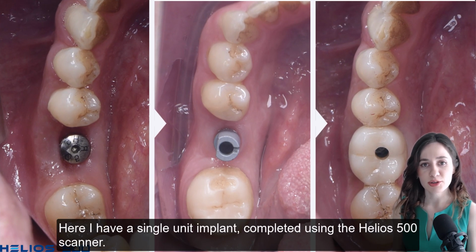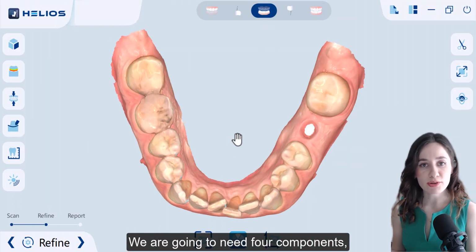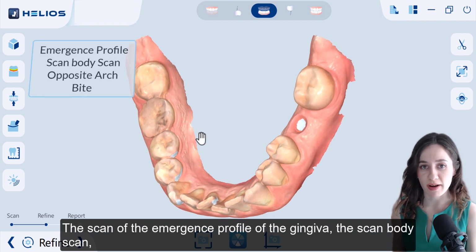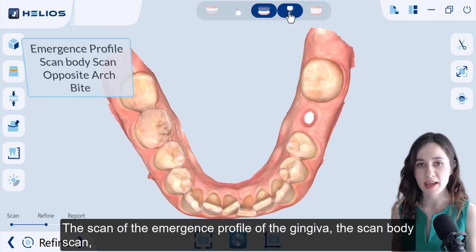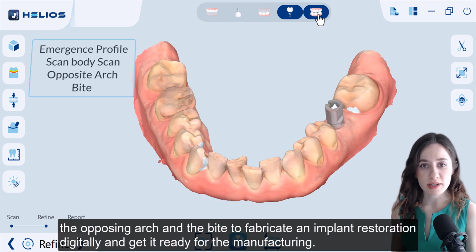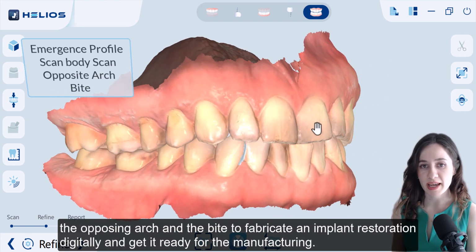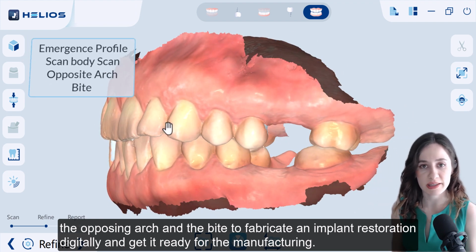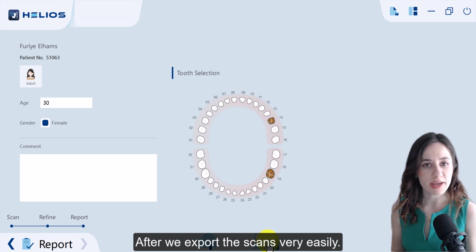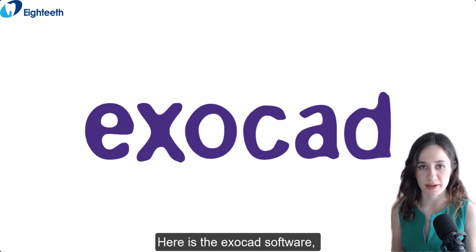Here I have a single unit implant case completed using the Helios 500 scanner. We are going to need 4 components: the scan of the emergence profile of the gingiva, the scan body scan, the opposing arch and the bite to fabricate an implant restoration digitally and get it ready for manufacturing. After we export the scans very easily, here is the Exocad software.